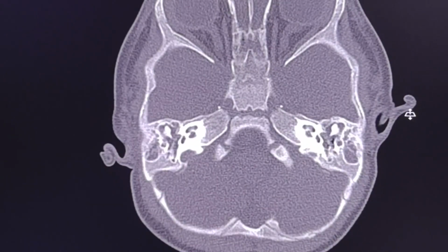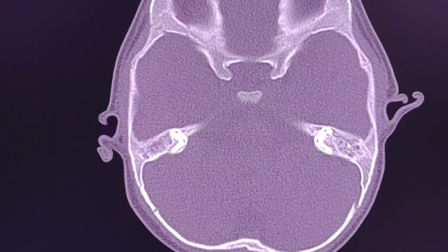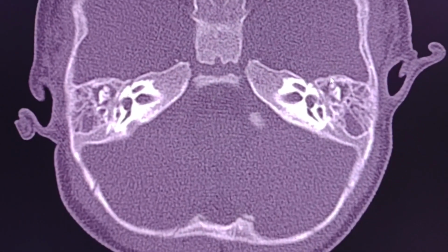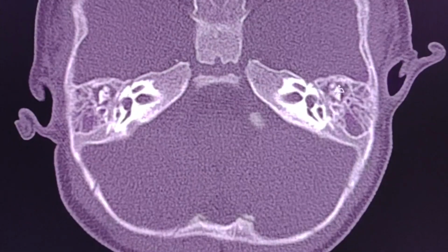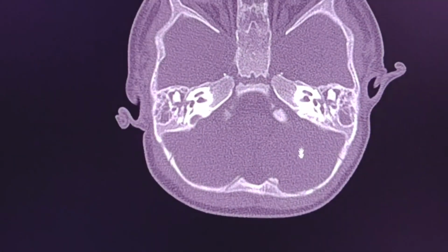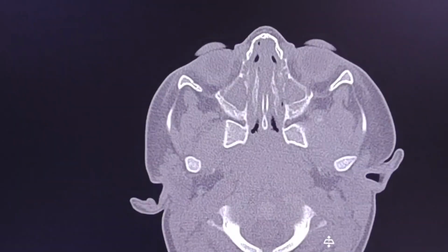Here in bone window, we can see the opacification of the mastoid air cells and the middle ears. Let's zoom in. Okay, so we all agree that there is opacification bilaterally. There is also opacification in the paranasal sinuses as well.